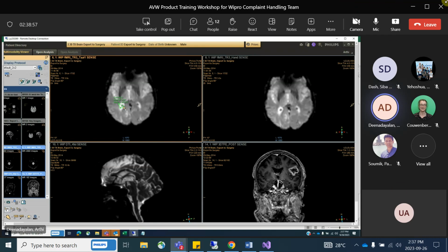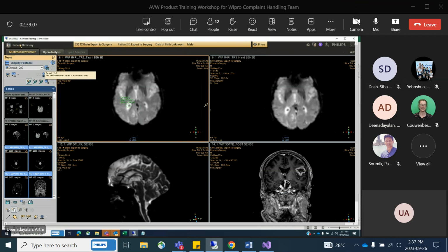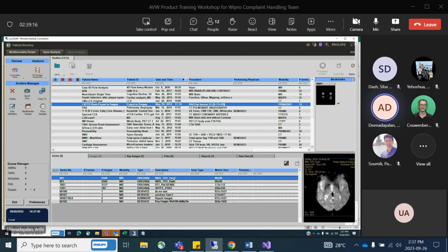I'll tell you how it is checked. Go to the PD, select the series. These were the two series which are linked, right?